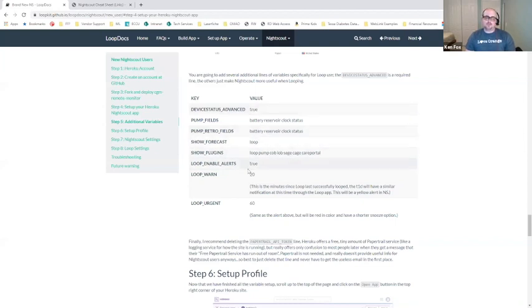So some of these other defaults are here too. But show plugins is what you want to turn on in that plugin section all the time. Very nice to use. We got alerts enabled and all that. Okay, let me go back to my picture.